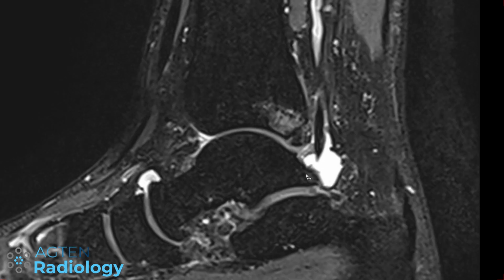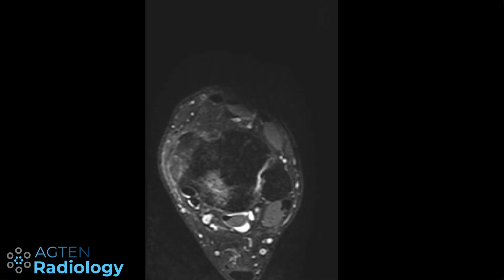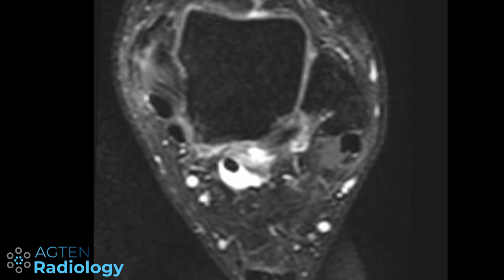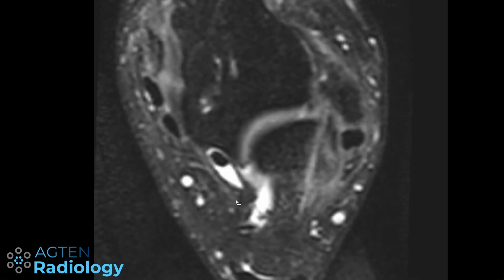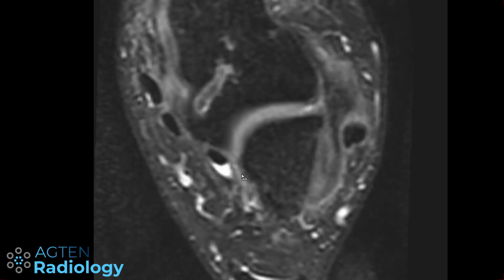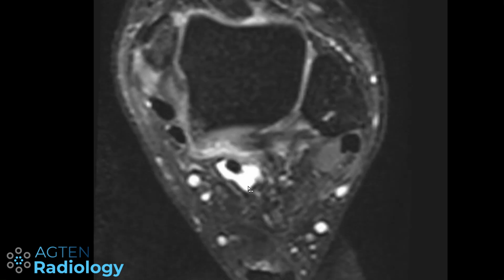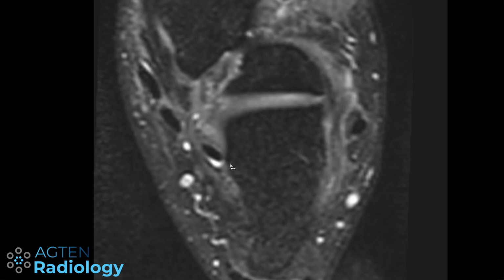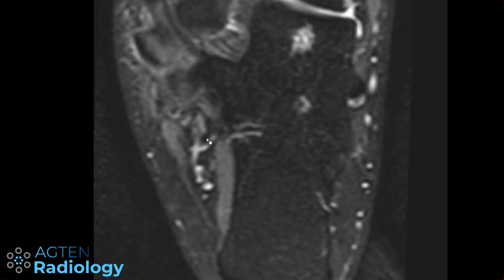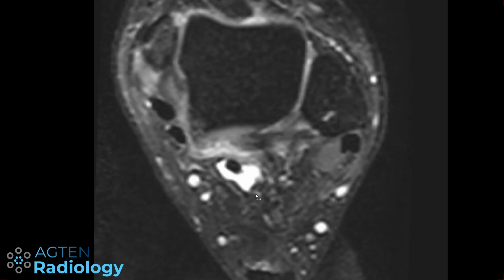Just a little side note here, you can see there the FHL with quite a lot of fluid here. Just keep in mind that in 20% of the cases you can have fluid in the tendon sheath of the FHL, and it's still considered to be normal because in 20% of cases there is communication with the joint space. So this alone doesn't really make a tenosynovitis of the FHL. You can raise the suspicion of tenosynovitis of the FHL if it's really extensive, going all the way down, and there are some criteria in the literature which we will not cover today.